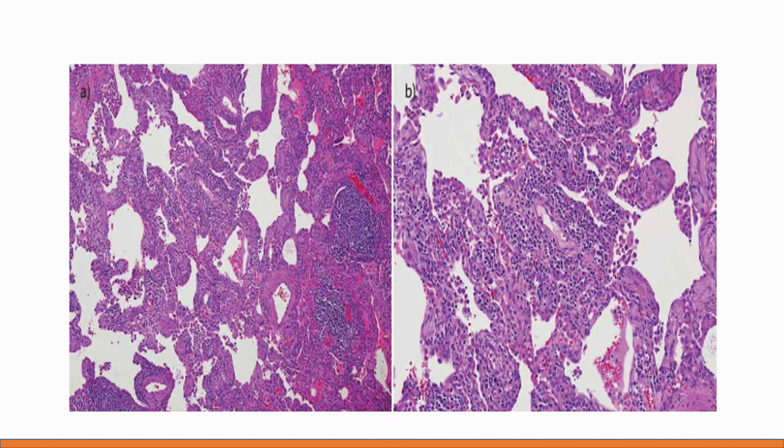And do we have fibrosis? Not much. But again, it depends on what the primary cause is. Sometimes when we are dealing with MALT lymphomas, or other immunodeficiency related diseases, there could also be other manifestations, and there could be solid nodular masses that have to be differentiated and excluded. So, in a typical appearance of LIP, we'll see diffuse infiltration of lymphoid cells and lymphoid aggregates. And in CT, we would see multiple cysts, bilateral, thin walled, random, with mild ground glass attenuation.